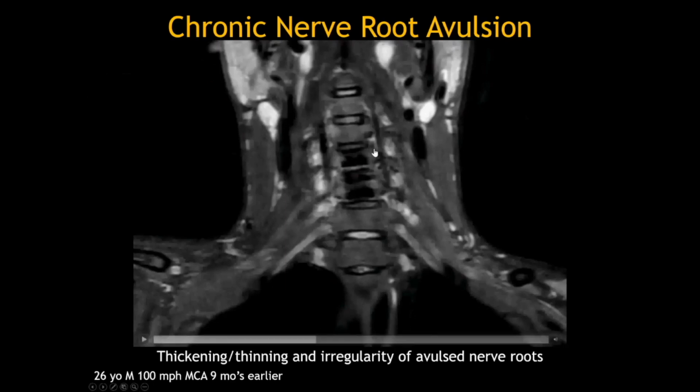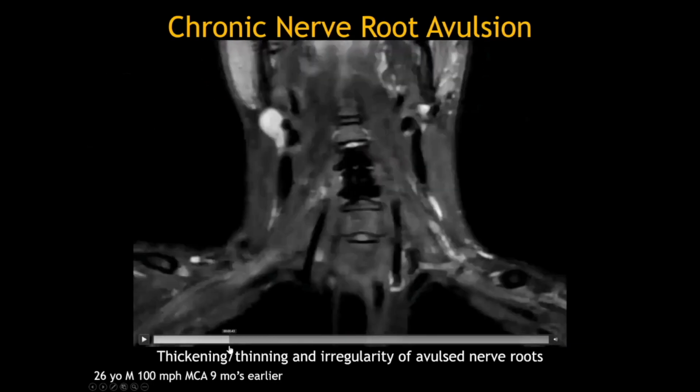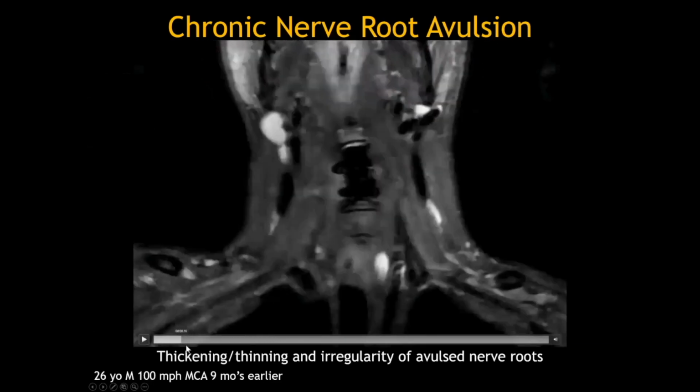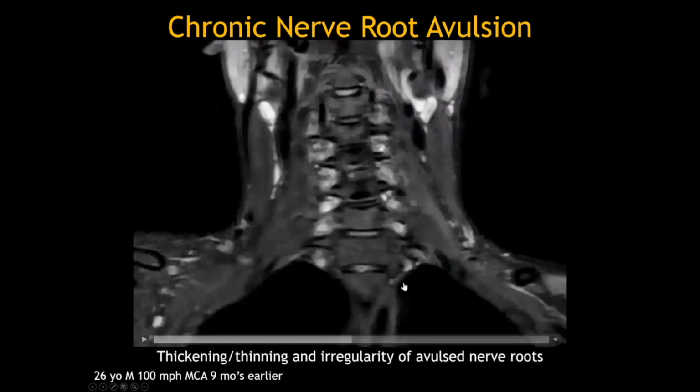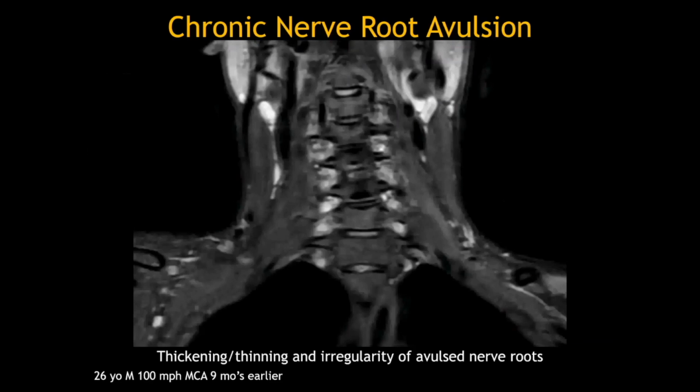And the reason why CT myelogram was used in this case was the presence of this metal artifact related to this patient already having an ACDF. So it was thought that a rootlet protocol MRI may not have been optimal to visualize the rootlets within the spinal canal.